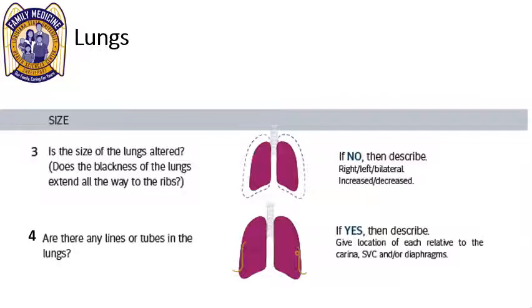So moving on to the lung size, if it's very small or hyperinflated, those would be interesting findings when it comes to, does this patient have restrictive lung disease, obstructive lung disease? Do they have no diaphragm, everything's flat from a hyperinflated COPD picture? Those are the things that you need to become familiar with when you're evaluating. Like, I think this patient has COPD, do a chest x-ray and there's flat space in the diaphragm and it's huge. You can barely get the chest in one image. Well, that indicates to you that most likely this patient has COPD, and that's a clinical diagnosis. Versus if you have normal lungs, everything's fine, then it's less likely that they have COPD.